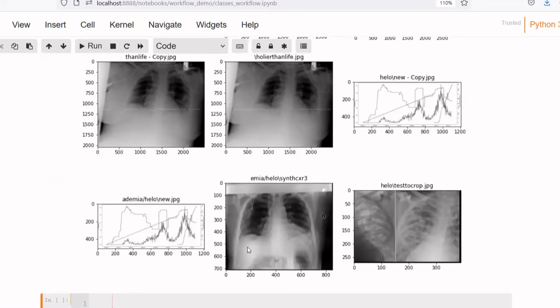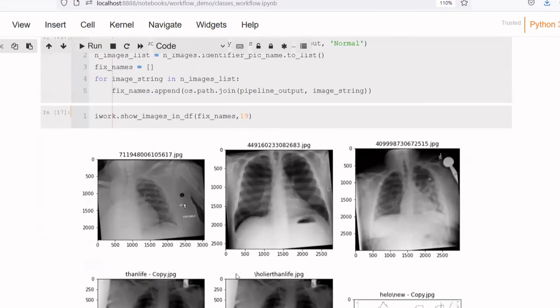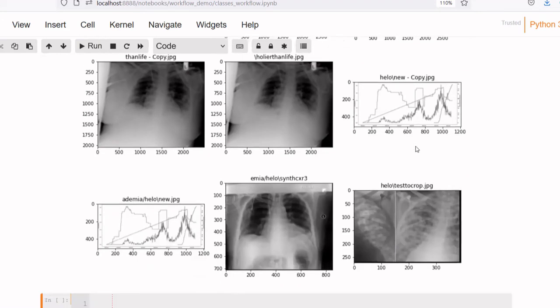So here we see my image got cropped, and lo and behold, the histogram normalizing seems to have darkened up my graph images, as well as a couple other images. There's also a kind of normalizing in the pipeline that does not work on histograms and simply shifts all the values between 0 and 255. There are many, many other functions in the code for cleanX, functions that allow many different types of augmentation and synthetic augmented data creation.